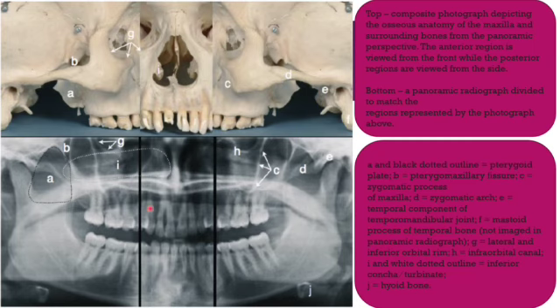And then coming to G, G reflects a lateral and inferior orbital rim. And H, see here, H is the infraorbital canal, and I indicates the inferior concha or the turbinates. So I is marked over here, and this shows the inferior concha, and J indicates the hyoid bone.